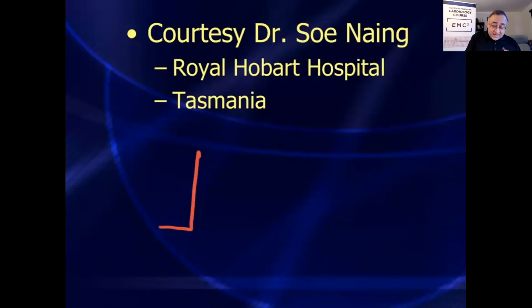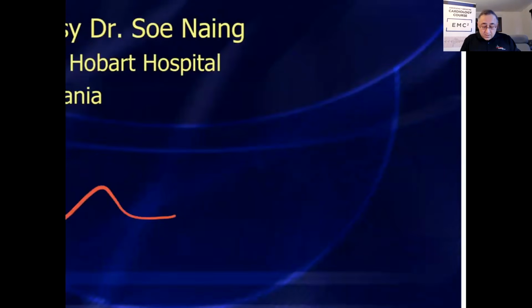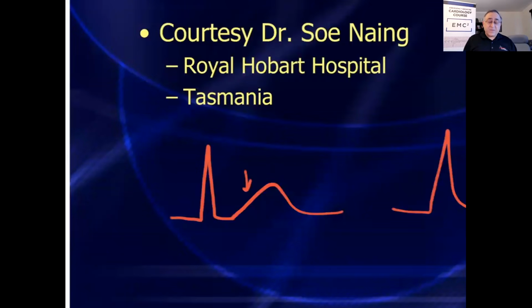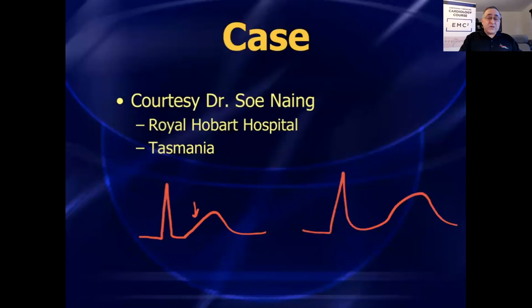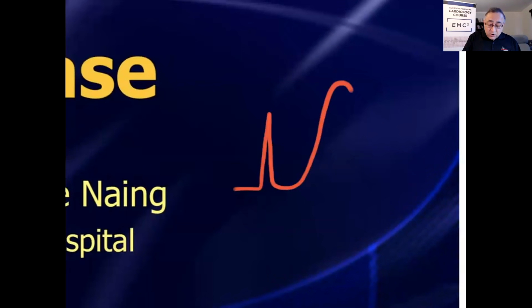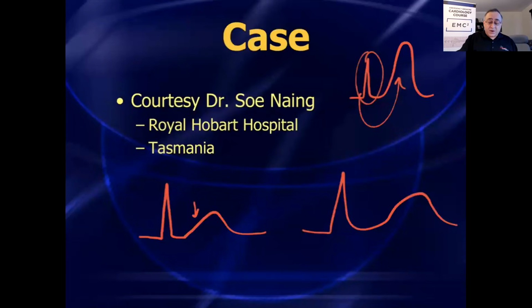As I mentioned at the very beginning of this course, I talked about hyperacute T waves that are defined by a very straight initial part of the T wave. When the initial part of the T wave is very straight, as opposed to a nice concave upwards, that's a nice normal T wave. But when the initial part becomes very straight, you worry about that. That's the type 1 hyperacute T wave we talked about at the beginning of this morning. Now we're going to talk about type 2 hyperacute T wave. And that, to me, is when the T wave is so large, you can take the entire QRS and fit it inside. If you ever see that, you've got to worry about early cardiac ischemia.